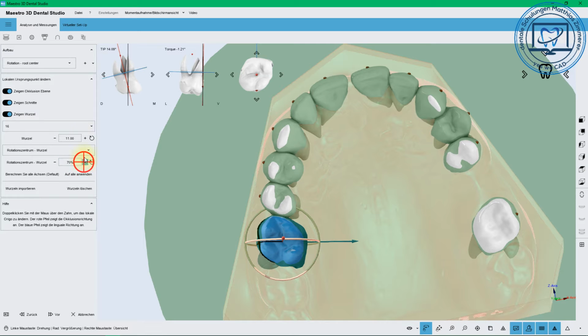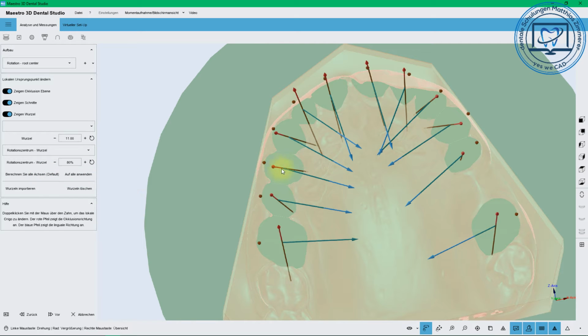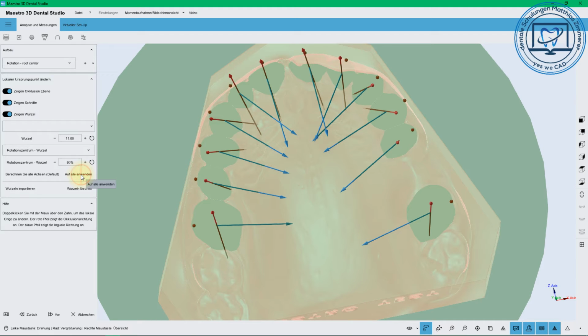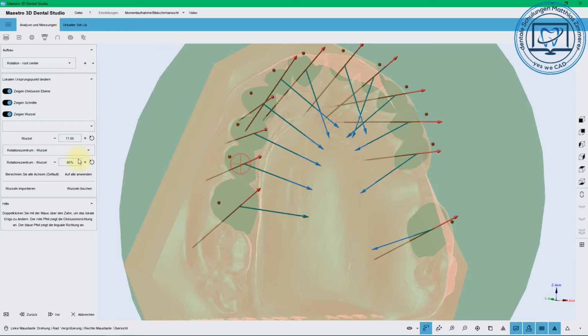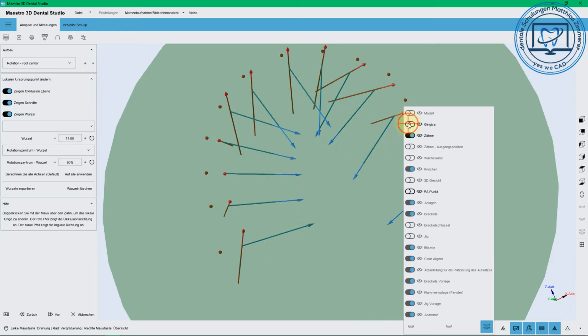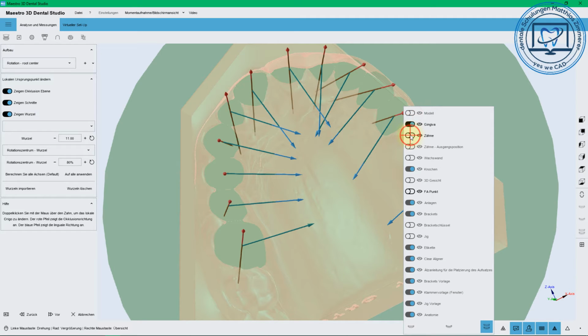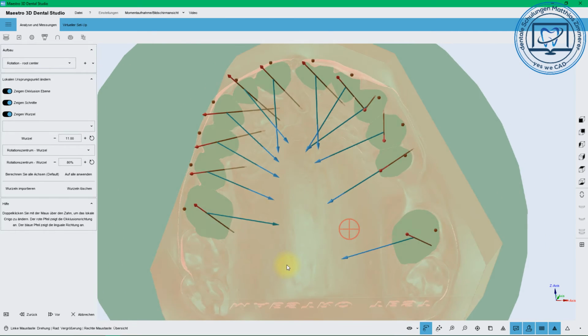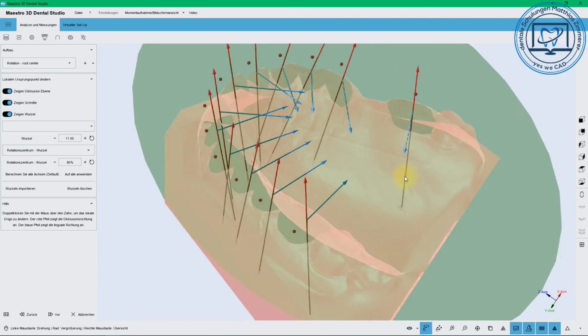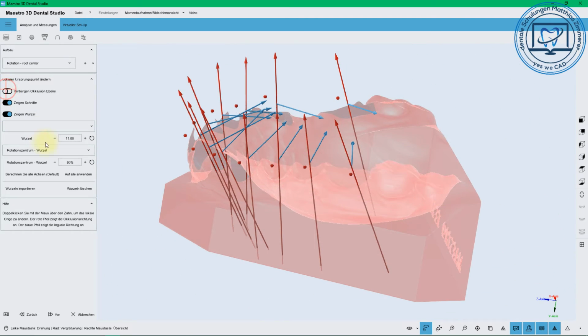Moving the roots, it is very necessary to know what you're doing there. If this is done badly, you will get bad results. The best would be to have an OPG, then you can measure it, or a CBCT. It sounds easy with CBCT, but it isn't. If you have bad CBCT DICOM data, then you normally have not much chance to extract the roots, and this would come out as roots that are, most of the time, not the best.